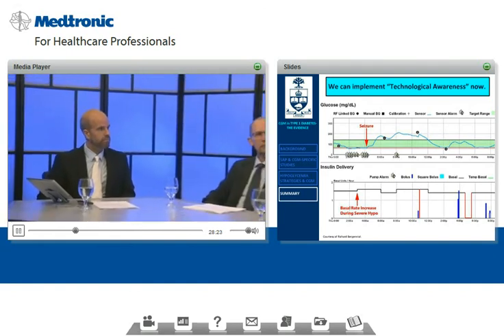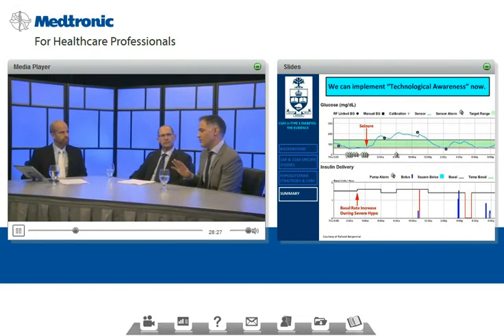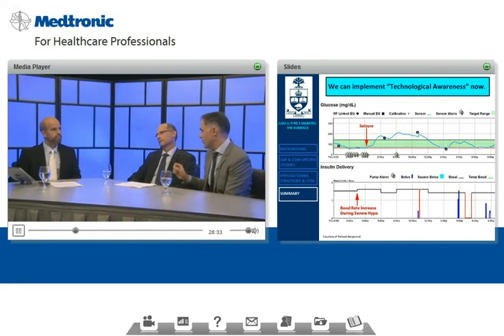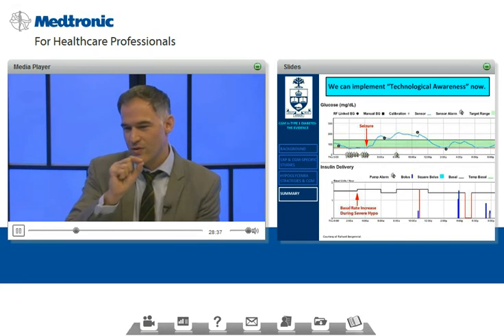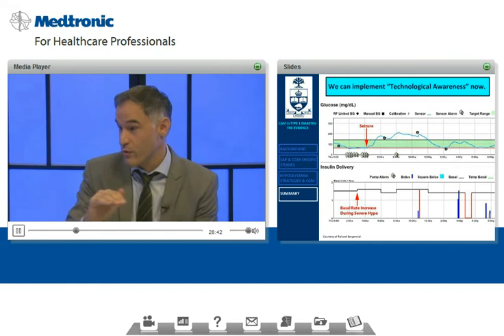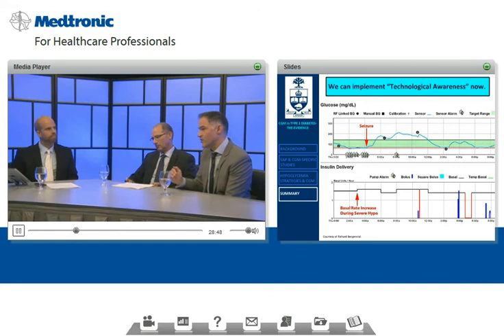Yeah, well, this we can see in two regards. The first thing is what kind of algorithm is used. So here we're using an automatic pump shutoff at a specific threshold for 2 hours. And that's a pretty simple intervention. Maybe there is a certain trajectory of blood sugar before it reaches hypoglycemia where we would choose to decrease basal or shut it off for a shorter period of time. And there might be other situations where we would safely say that we would do it for a longer period of time.